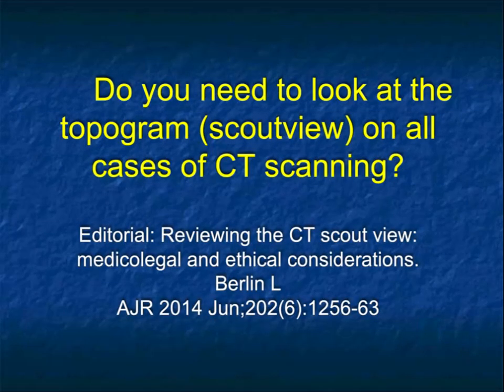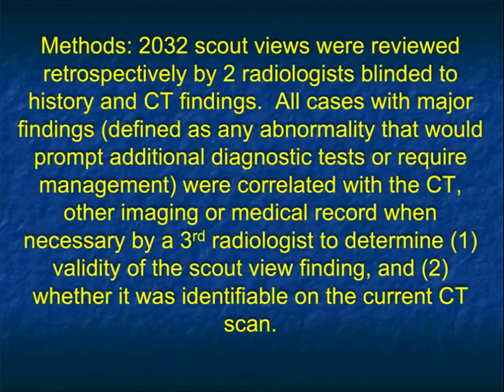Now the reason this came about is Leonard Berlin, who's written a lot on medical legal issues, wrote a lot in AJR a number of years ago, called me up and asked me, do I look at the topogram on every case? And when I said, not really, he asked, what about the rest of the people? One of our staff raised their hand that they did, and I knew they were not telling the truth, and I told them that. So people don't routinely look at the topogram. Everyone says the same thing. Well, I look at it if I have a question. That's not what I asked you. Do you look at it every single time, even without questions?